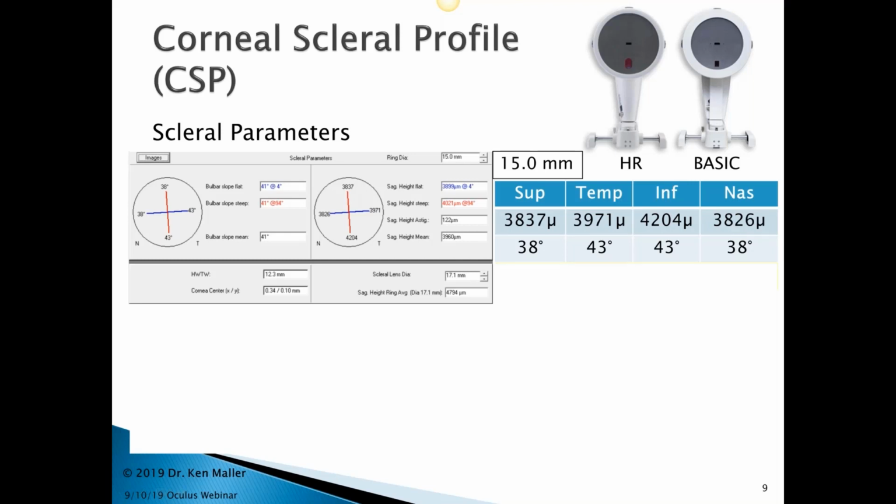It also does give you, on the left-hand side, the actual slope or the angle that, at that instantaneous point, the sclera is actually changing at. So this gives you a sense of how steep things are or how flat they are right at that particular chord.